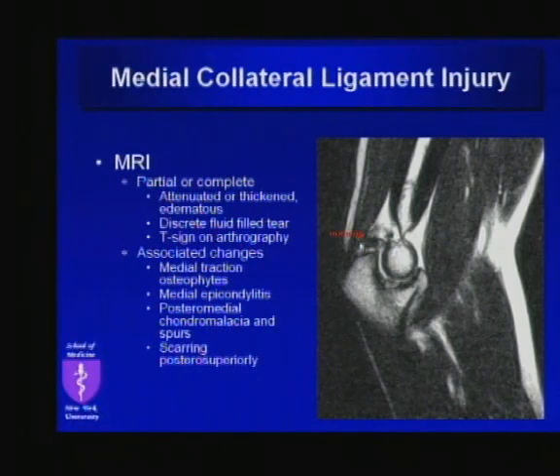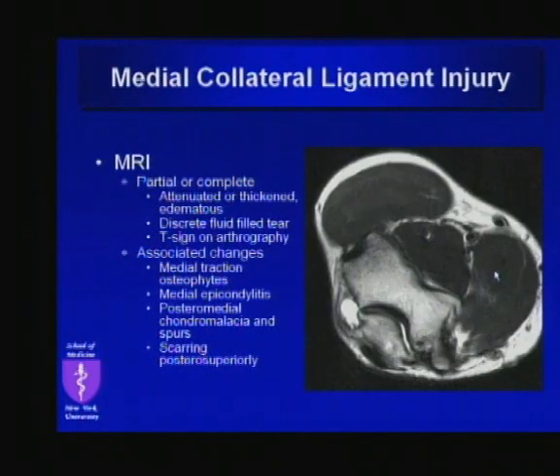is this ball of scar tissue, synovitis, and debris posterior superiorly, so this patient is presumably going to have limited extension. Now, with all of these changes posterior medially, it's no wonder that the ulnar nerve won't really have much room to breathe. So in this particular case, they did a subcutaneous ulnar nerve transposition. So this shows us all of the associated signs we see with MCL injury.